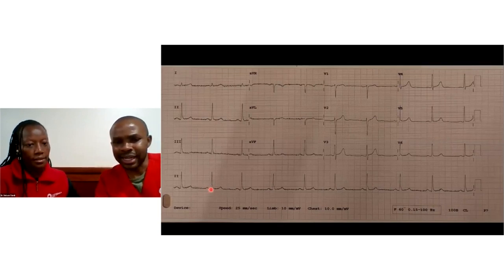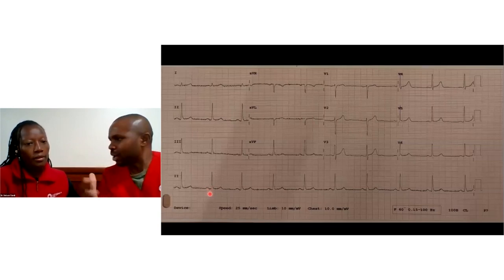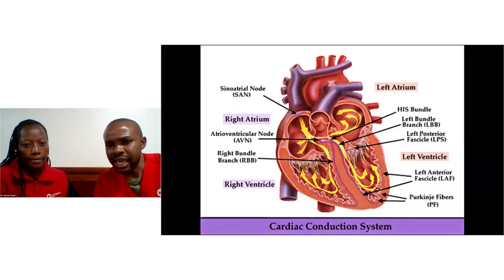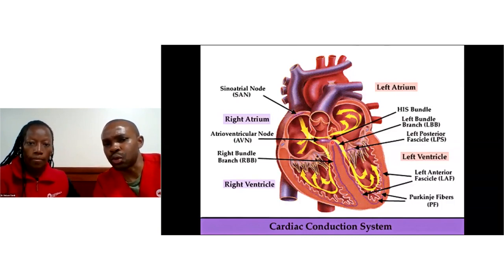Yes. All right, and that's the flat line we are seeing here, which means there's no electrical activity recorded at that time. Yes. And after that, which is the AV node right here, we are saying the current now flows through the bundle of His, which is this proximal part, and thereafter quickly goes through the various bundle branches.